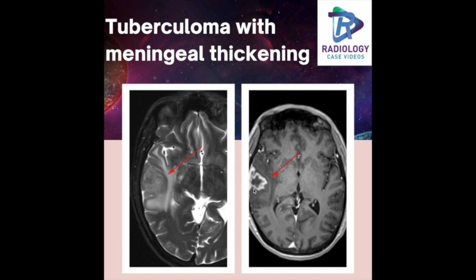And these features favor the diagnosis of tuberculoma, and on MRS, most of the cases of tuberculoma show lipid lactate peak. There are few differential diagnoses like fungal infections, metastasis, neurocysticercosis, etc.